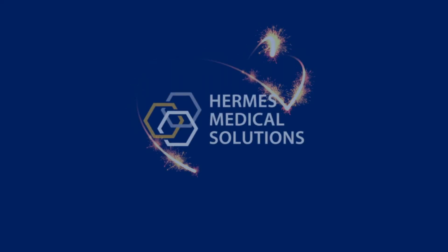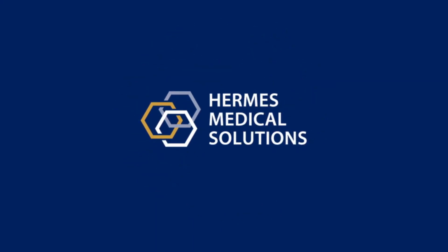That was a brief demonstration of the liver remnant analysis tool from Hermes Medical Solutions.